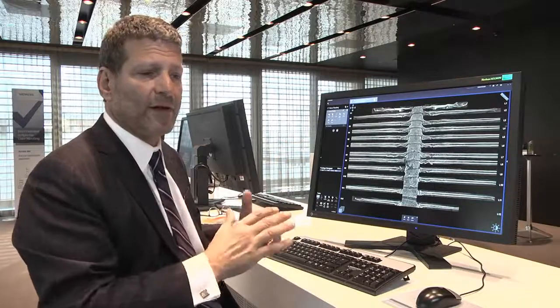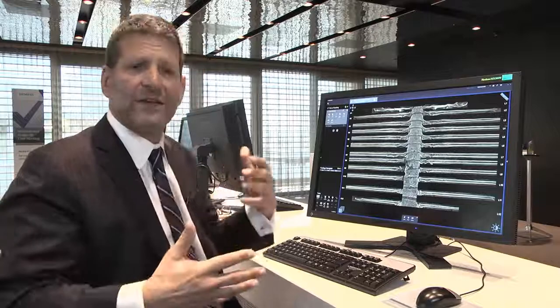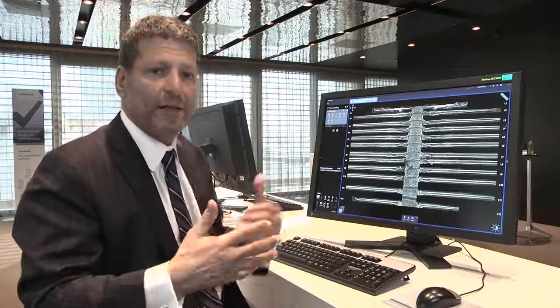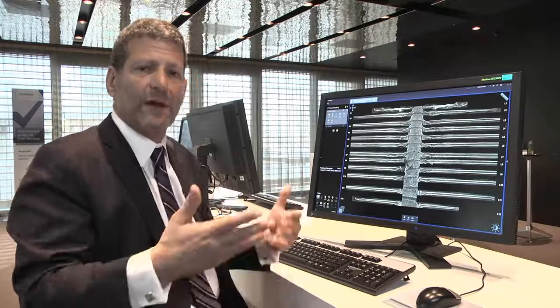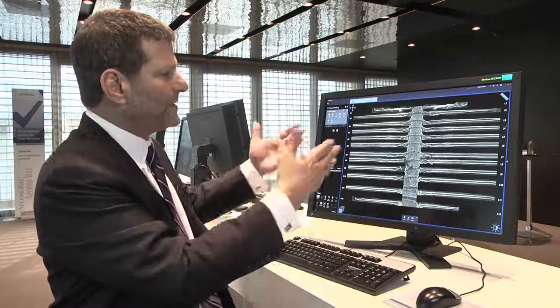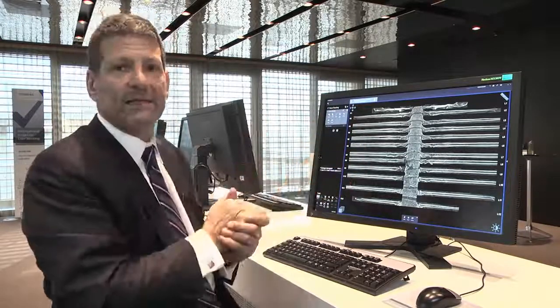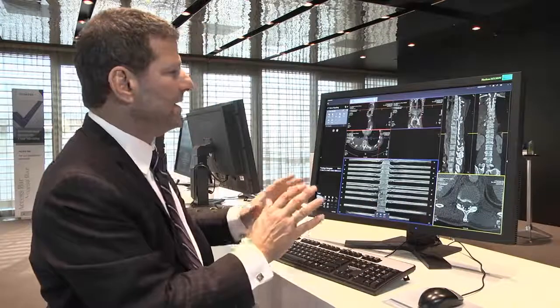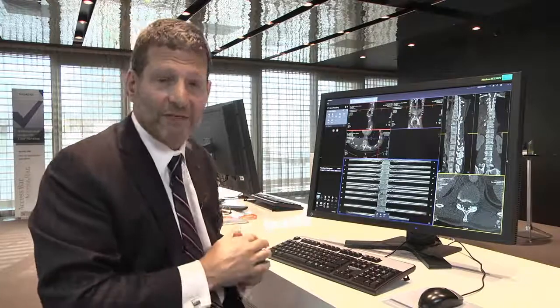I look at oncology cases where the reading physician is concentrated on all of the typical staging criteria, but neglects the ribs because they're very difficult to read on axial images. You pop these images up like this, and metastases stand out just as strikingly as these individual fractures. So this tool, all of this integrated in a nice workflow fashion, is really one of my favorite tools, and I think makes a big difference in day-to-day practice.